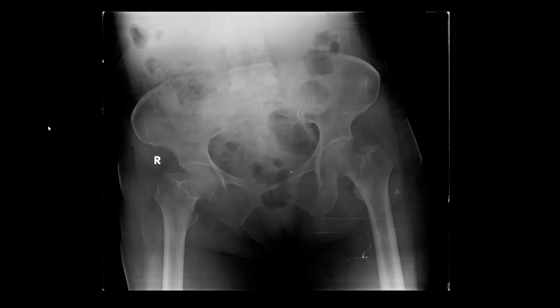So I'm so much concerned about a destructive lesion in this adult patient. My top differential is a metastatic process. I would like to compare with any previous imaging, if available, or any other relevant images. I would like to correlate with the patient's history for any known primary disease. I would like to urgently convey my finding to the referring doctor.